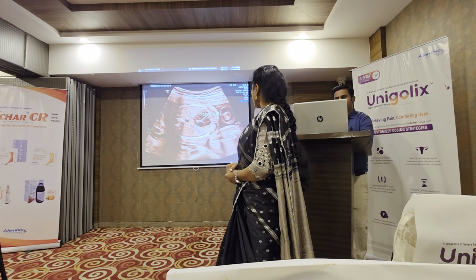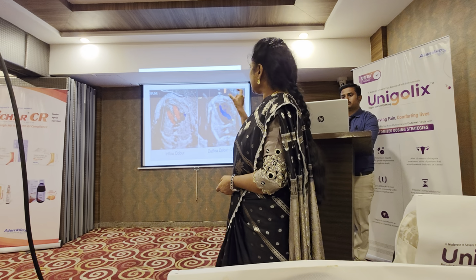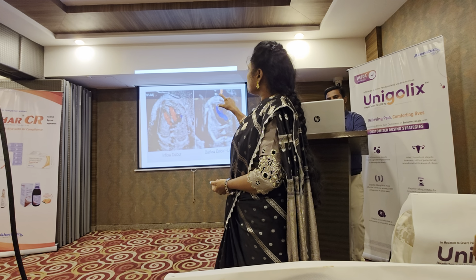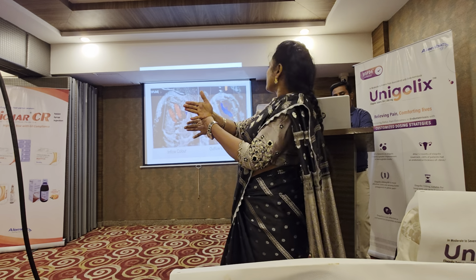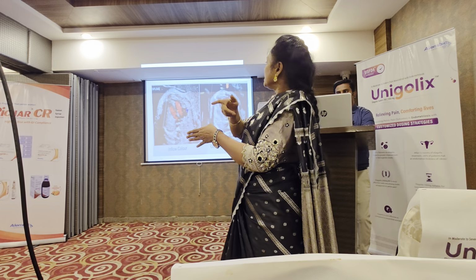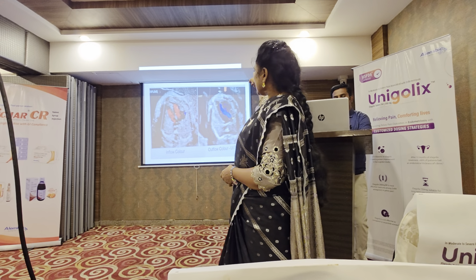Next one. It's the 4-chamber heart. Next one. So what are the things that we see in the Doppler of the heart? In the 4-chamber view, once you switch on the color, you should see the inflows. In the outflow, they should crisscross. That is, the aorta comes from the left ventricle, and the pulmonary artery comes from the right ventricle. They both cross each other.